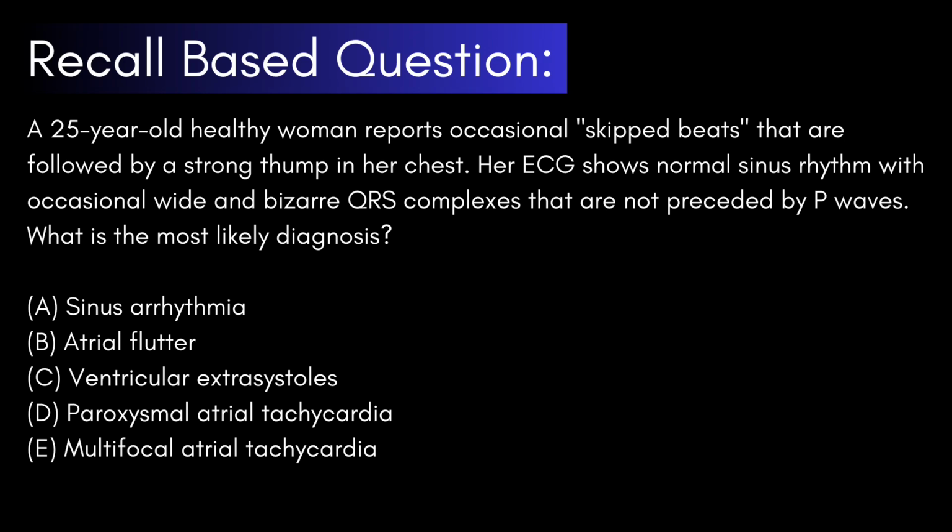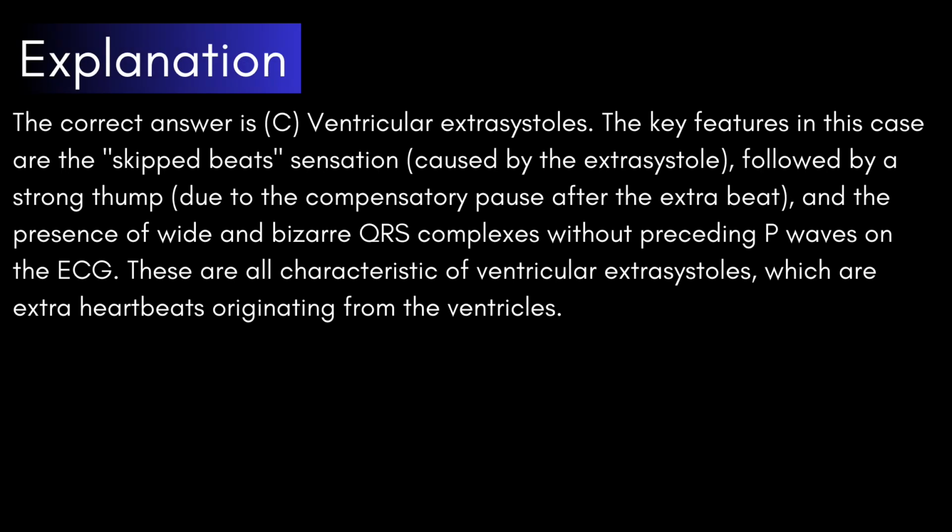All right, I think I gave you guys enough time here. I'm going to move on to see what the correct answer is and what the reasoning behind it is. If you need more time, feel free to pause the video. Otherwise, moving on now. The correct answer is C, ventricular extrasystoles.